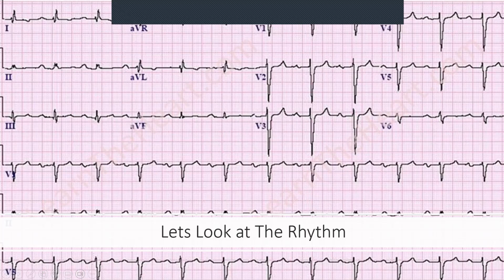So what do you think? Is it first degree, second degree, third degree? First degree. Very good. So first degree heart block, PR is lengthened. Consistent. It's just lengthened. What it means is that from the SA node to the AV node, in that atrioventricular septum where all the pacemaker cells sit, there's something that's gone wrong there. Now, you can't tell what exactly from this, but you know there's something wrong.